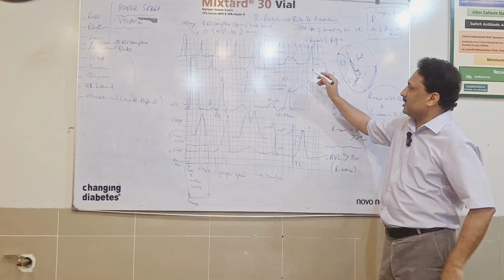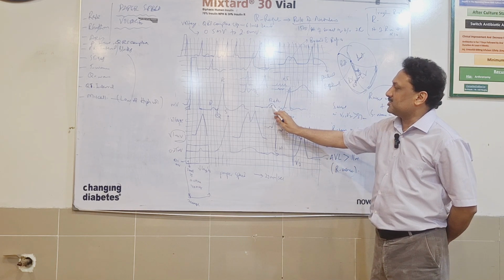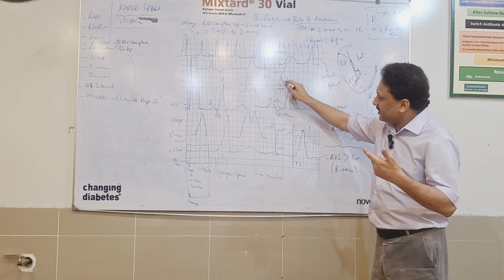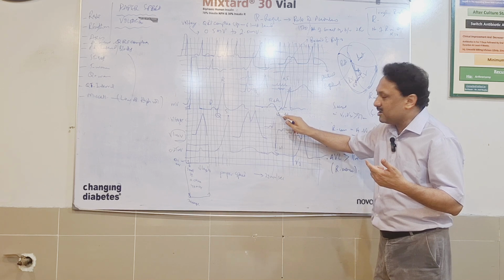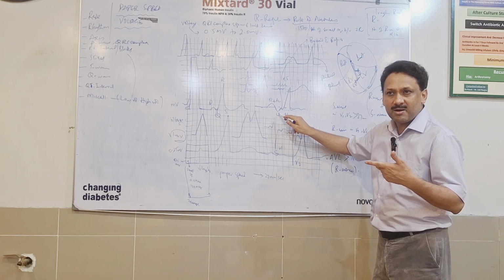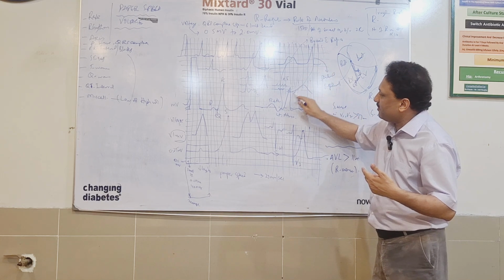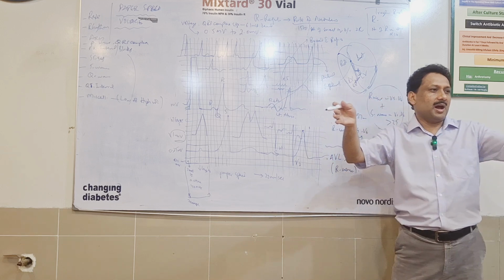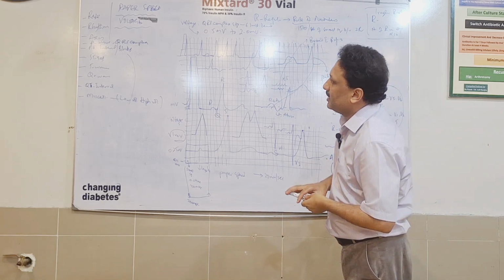So in this situation, the first component in a person that would be suggesting P mitrale would be like that. That patient would be having this second component deeper or wider. And the person with P pulmonale would be having this first component either more than 1 mm broader or more than 1 mm in height.